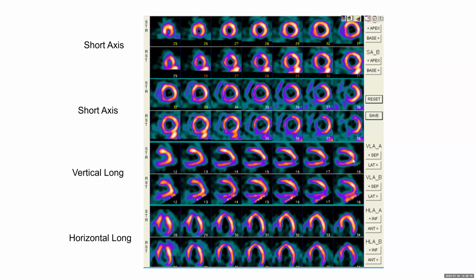One of the things that may limit it is the cut through the horizontal or vertical, both of them. But you can see that there is a slight improvement here in the perfusion defect. That is not consistent here. So that's the area where you see the ischemia. And the horizontal also confirms this as you go through the segments, with a mild improvement on rest.